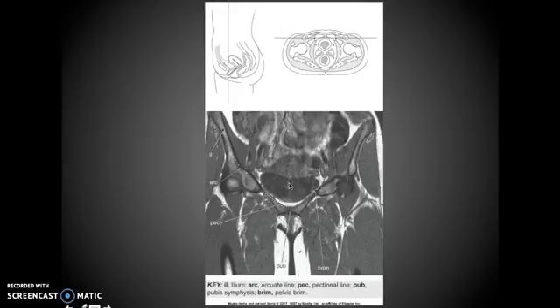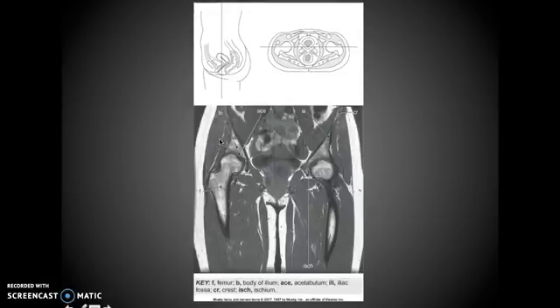The pelvis never breaks in one spot. It's always in 2 places. So if you see a crack in one side, there's got to be one somewhere else too. That's a general standard rule of thumb. So here's your pubis symphysis and your ilium.